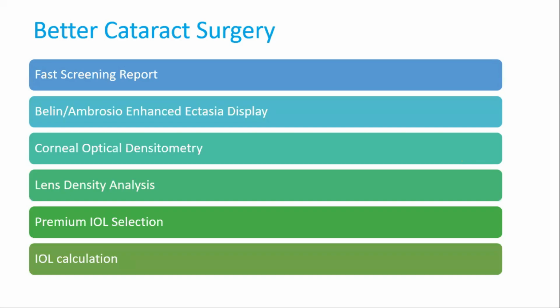So next, moving on to cataract pre-op evaluation. To perform a better cataract surgery, going through all these reports at a time helps the surgeon to plan better and have good visual outcome, especially when planning for premium IOLs.